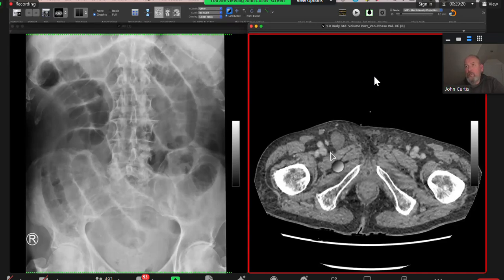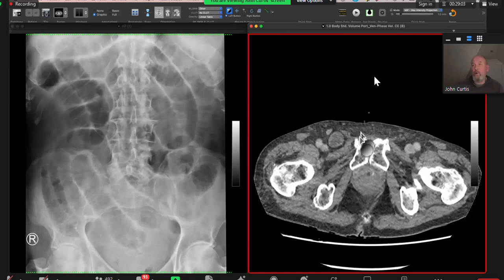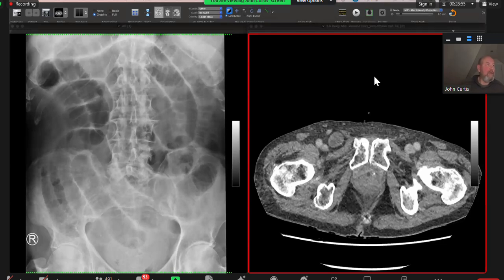So just to let the audience know, there's the left femoral vein, there's the right femoral vein, and it's squashed. And therefore, the bowel must be going in the femoral canal on the right-hand side to cause that squashing of the femoral vein. And inguinal hernias tend to be overlying the pubic tubercle. Yeah, well done. That was really good. Okay, I'll show you another.